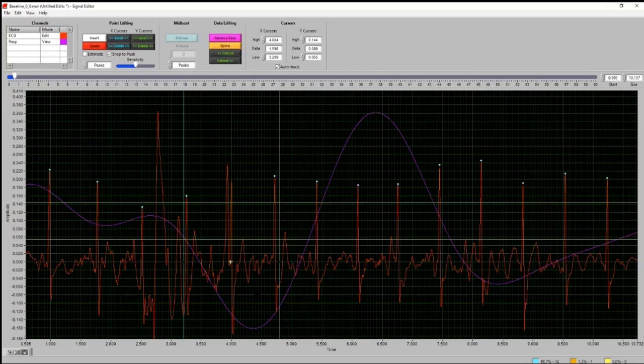An additional thing you do not want to do is get yourself into confirming biases here. So if we were to place a point here and the MindWare midbeat application tells you it's there, and then you move the X cursor and you're like, I knew it was that one, we really don't want to get into that, just for consistency's sake. If we weren't sure about it in the beginning, we shouldn't be sure about it at the end after it places that point there. So we really want to leave it there.